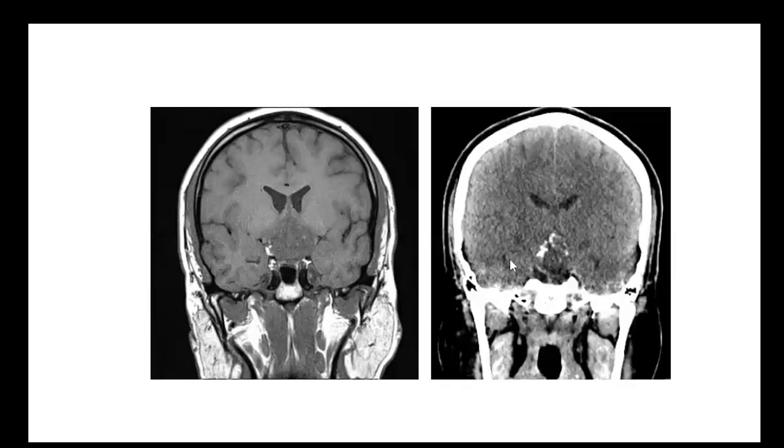I think the features that will help you here are these little loculated areas of T1 shortening, which are very typical for craniopharyngiomas. Whenever you see those, that should really get your attention. Rathke's cysts are usually bright all the way through. And of course, the calcifications in a young person, in the pediatric population, this patient's on the outer limits of that, about 85% of craniopharyngiomas are calcified. So this is a classic craniopharyngioma. Very good.